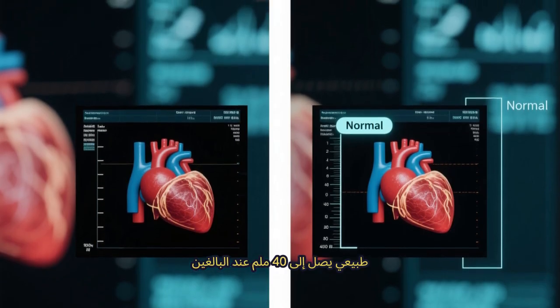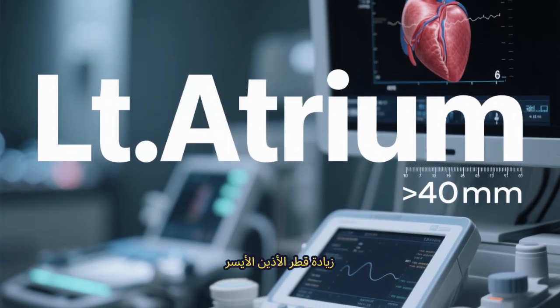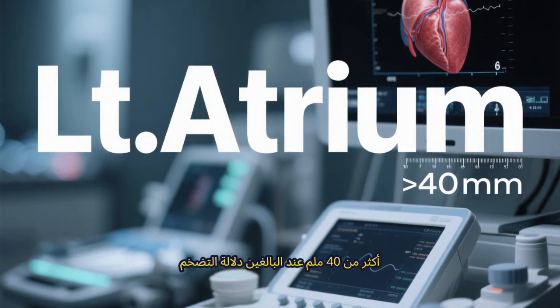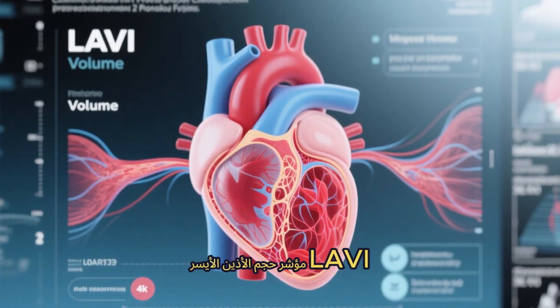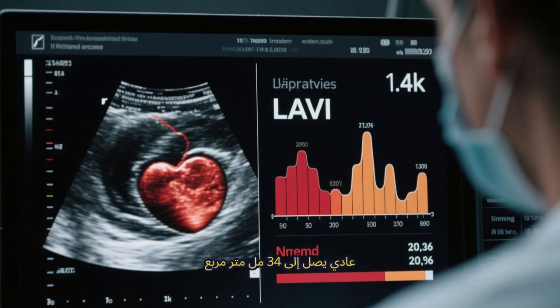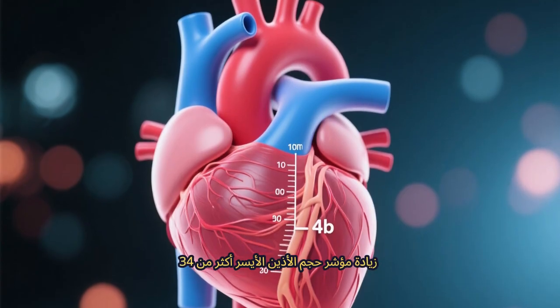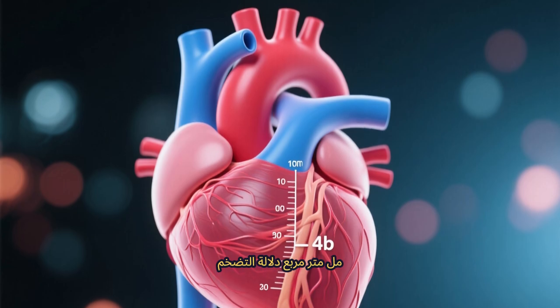Normal is up to 40 mm in adults. Increased left atrial diameter is more than 40 mm in adults. Left atrial volume index: normal is up to 34 milliliters per square meter. Increased left atrial volume index is more than 34 milliliters per square meter.